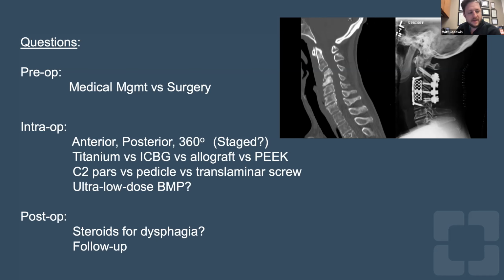Yeah, on the comments about the plate, I'll sometimes cut the Harms cage so there are little tabs, and you can put a screw through the top and the bottom to hold it if you're going to back it up. But I agree. That plate's so flat and so flush, I don't think the plate's the issue. I think that looks great.